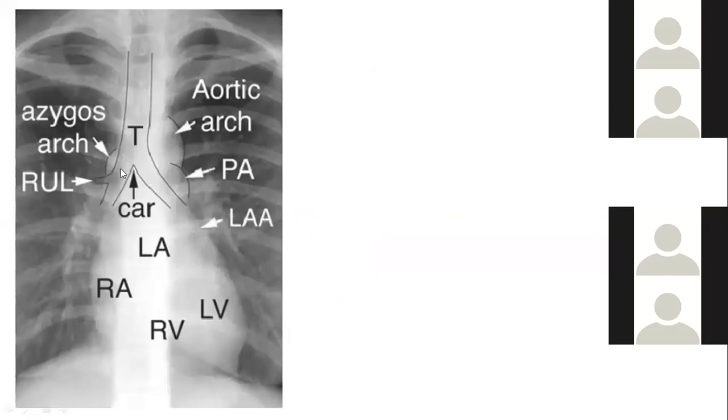So on a chest X-ray, what are the boundaries of the mediastinum? We should know this. This is a very basic radiograph, a chest X-ray posteroanterior view. First comes the right mediastinal border. From inferior to superior, we start with the right atrium forming most of the inferior right cardiac border. Then as we gradually go up, it will be the superior vena cava. This is called the cavoatrial junction, which is very important, especially when we have to locate the tip of the central venous catheter.